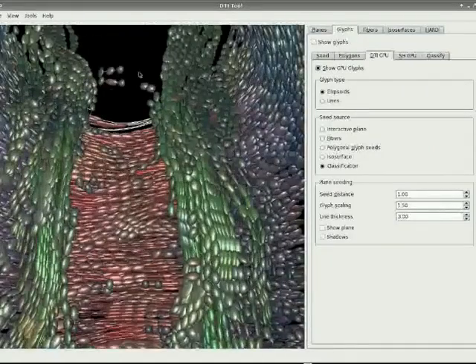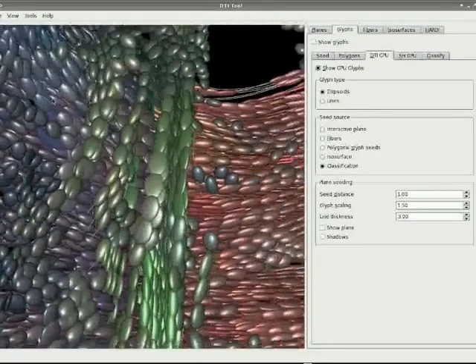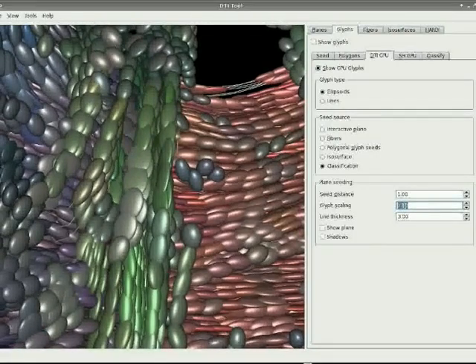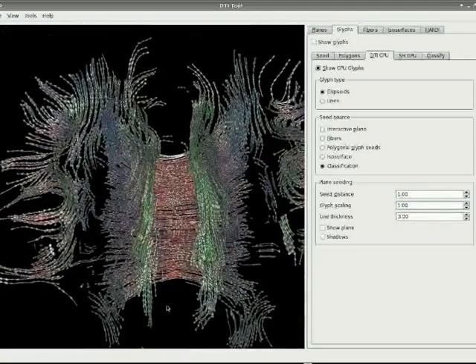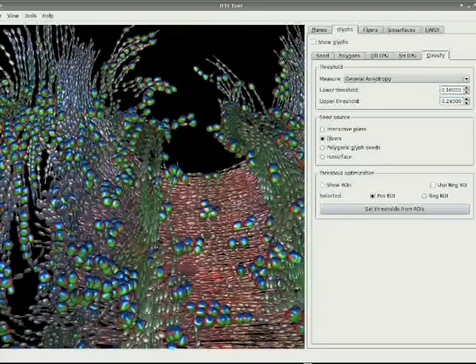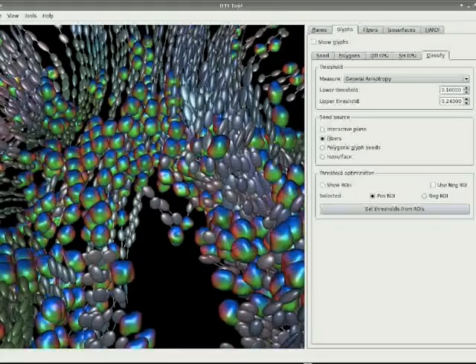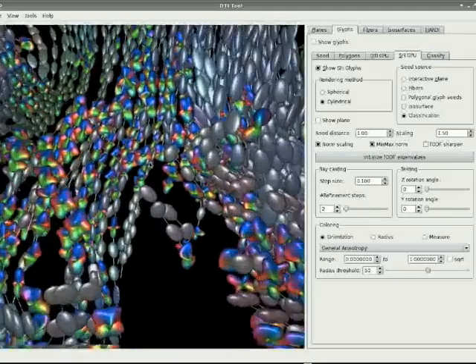At the end, we can place the fibers at seed points for the glyph visualization and verify the outcome of the fiber tracking. Now we are looking at the tensor glyphs placed on the fibers, but we could as well perform classification on these kind of seed points and see how the glyph profiles would start changing into non-Gaussian. We can furthermore inspect the data and apply the previously described interactions like min-max normalization.